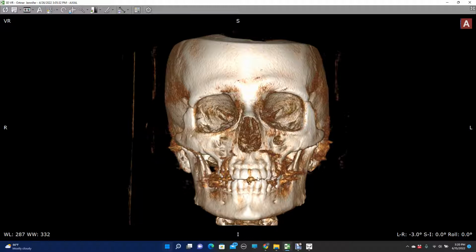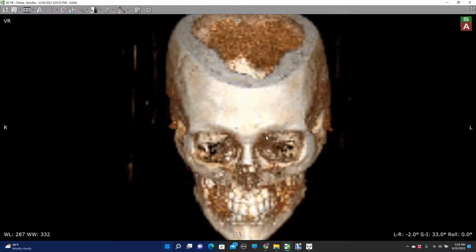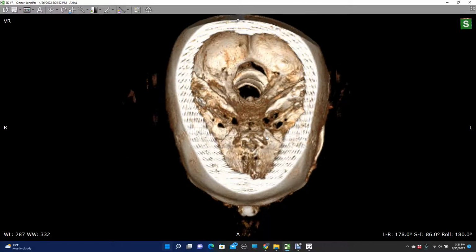And so this should be a fairly unrotated skull, and in traditional methods we would measure the lateral canthus to the outside of the skull to see if our frontal is rotated. And you know what, this one's considerably larger than this one, so I actually may take it one more degree that way. And now it should be closer to symmetrical. And they're perfect. So we could just say, we're done, our frontal is unrotated, but I also kind of like to pitch it down, and then we can look to see, does that line up with that?